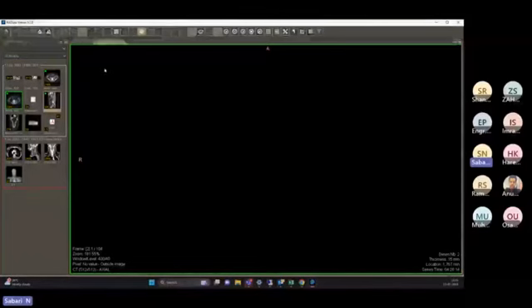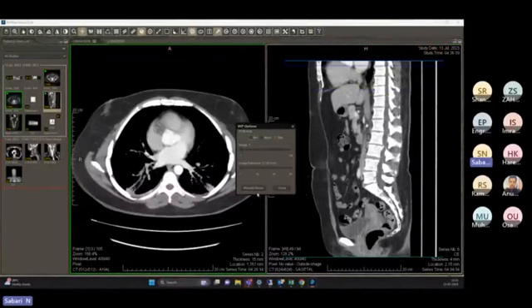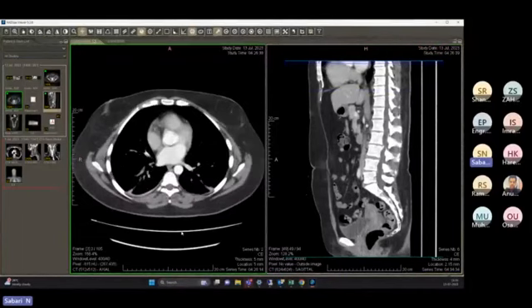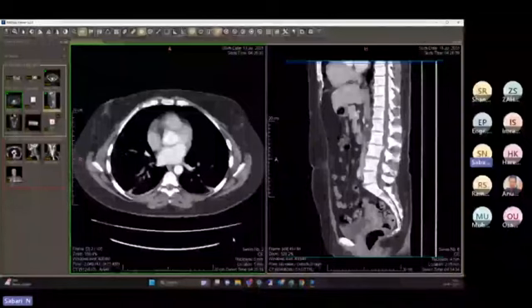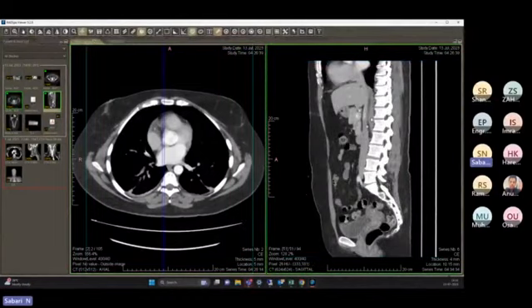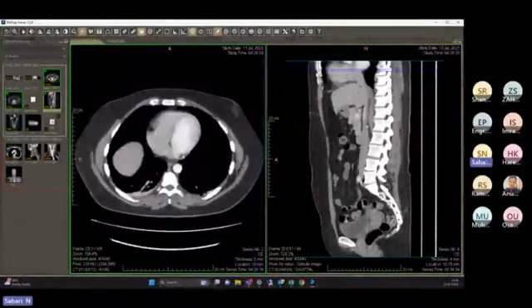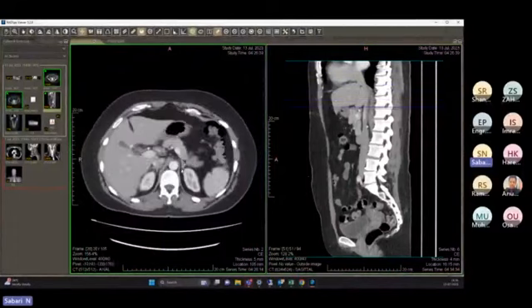So this is minimum intensity projection and maximum intensity projection, called MIP. These are the MIP options. It will rebuild the complete series, because the scan was done at 5 mm. They cannot call the patient back to do it at 10 mm, because the patient is already scanned and has left for the day. The radiologist is doing the reporting and notices they want another axial series with a 10 mm slice thickness. One thing is we cannot call the patient back; and second, it is also illegal, because the patient would go under radiation again and again, which cannot be acceptable.